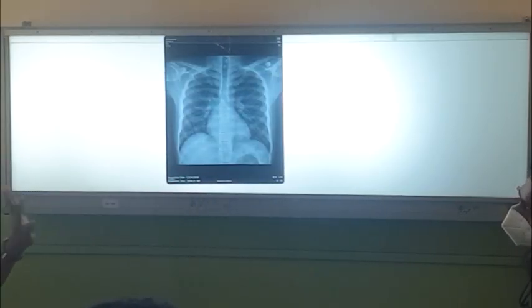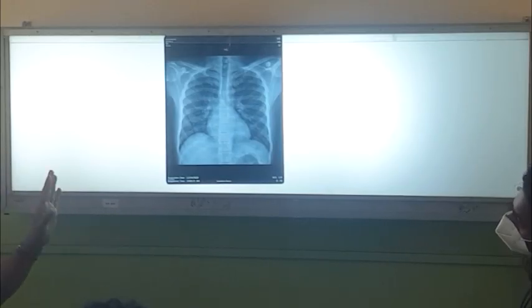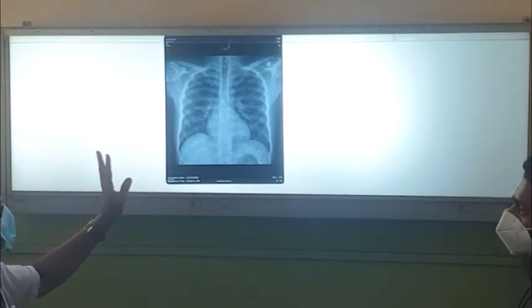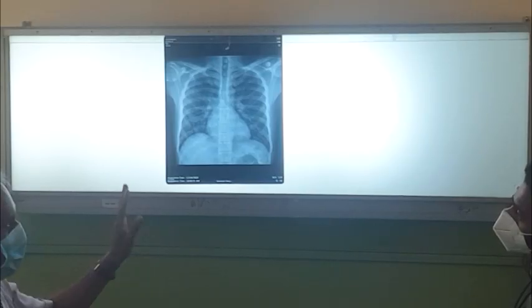Right. This one I'm just keeping here because this patient came to the private sector during this COVID period, a 40-year-old male patient with difficulty in breathing, right? They had done an X-ray and sent him back. The X-ray looked normal, but he came to the private sector.